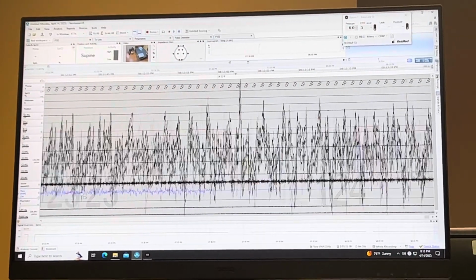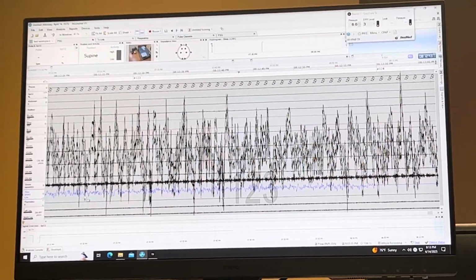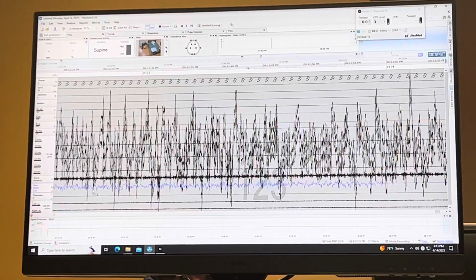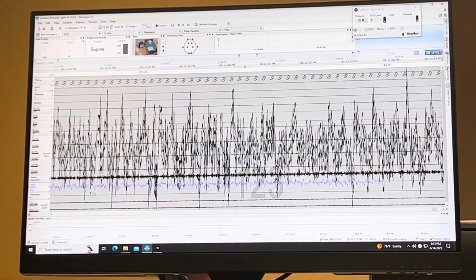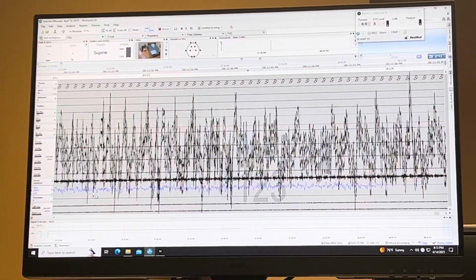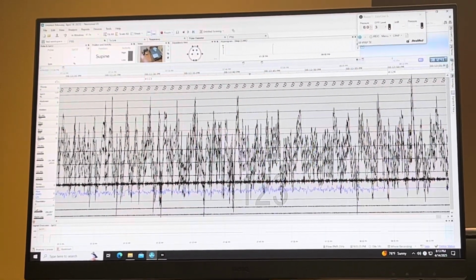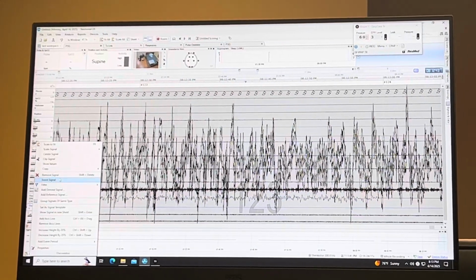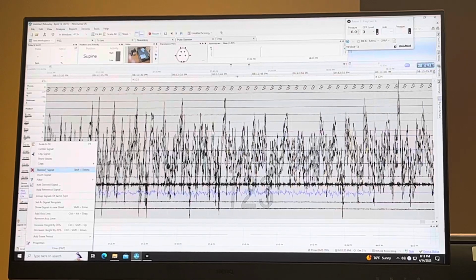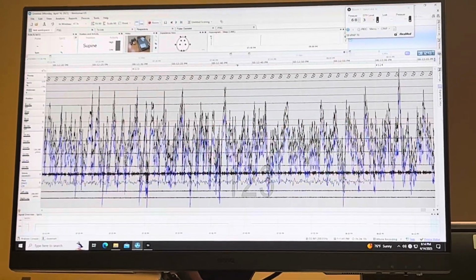Yeah, you can see event stuff, but then you wanna make sure that you've scored all of your diagnostic stuff first. I always go before it. Yeah. It would be nice for it, like, oh, I don't wanna see this, I'm done. It's the same thing, you can turn off your thermistor, you can remove your thermistor, you just right click, find it, remove signal, and then you come over here.